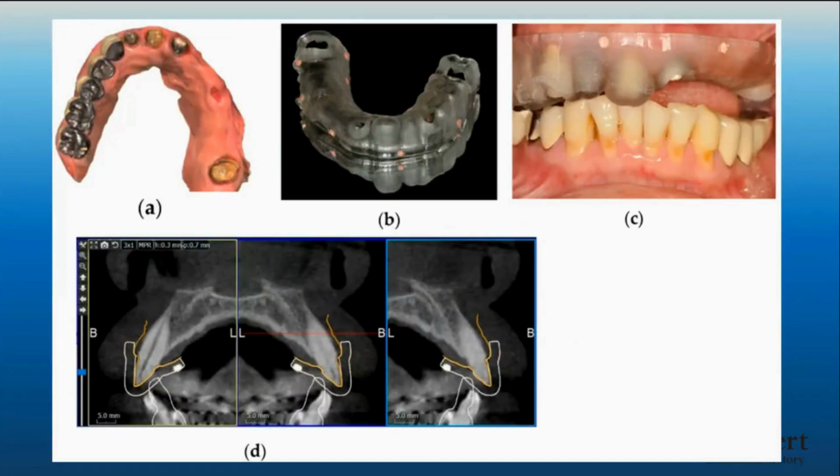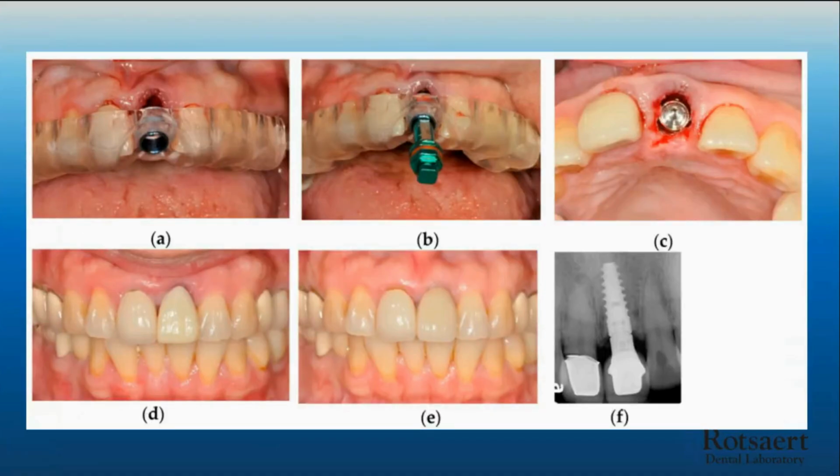Right. So again, the surgical guides are generated, they're lined up right when we're doing our scans, and then all that becomes integrated, if you will. That file is utilized. We do the final plan and integrate the sleeves into the final template.